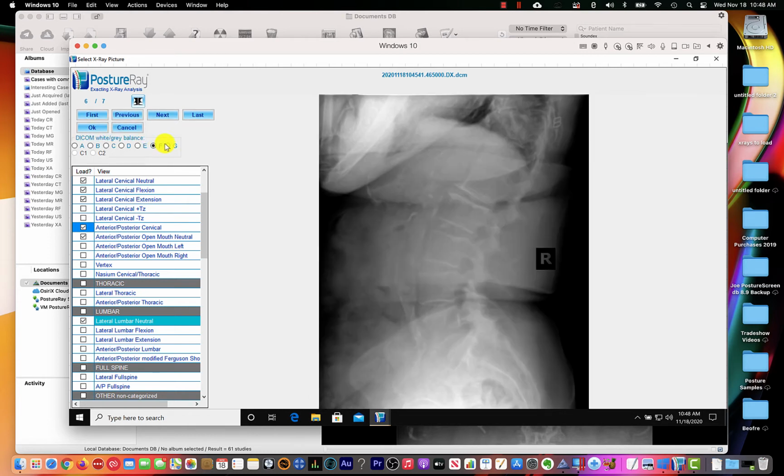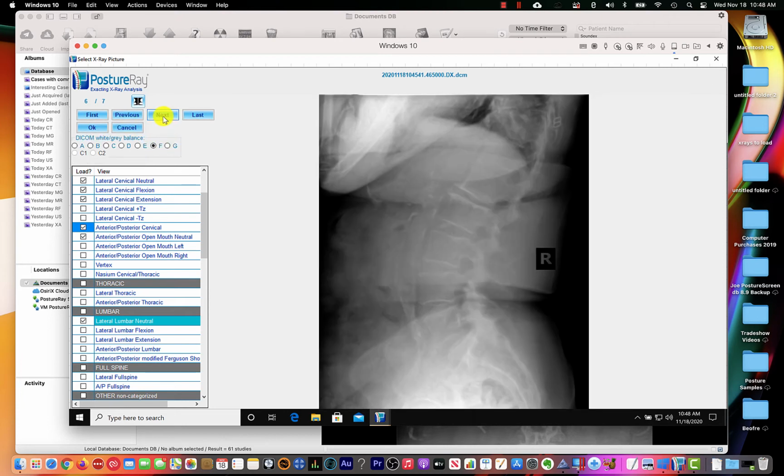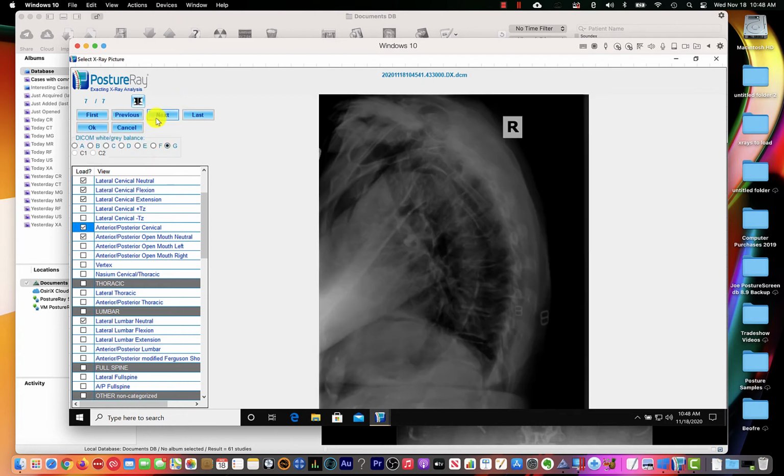Yeah, I'm going to pull it in as this one. And then let's see if that makes it a little clearer. That's not. I'll keep it darker on this one. I can always lighten it up. I'm just basically going through the steps to show you.